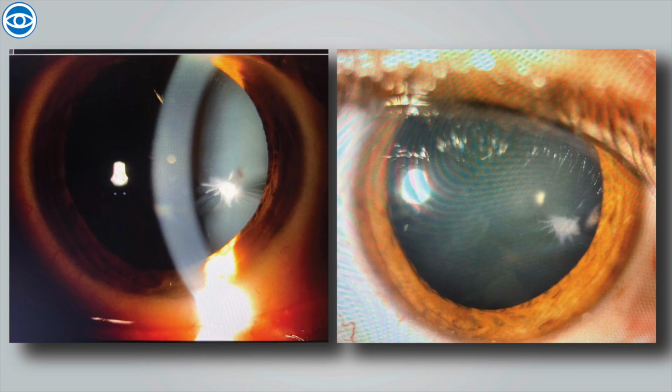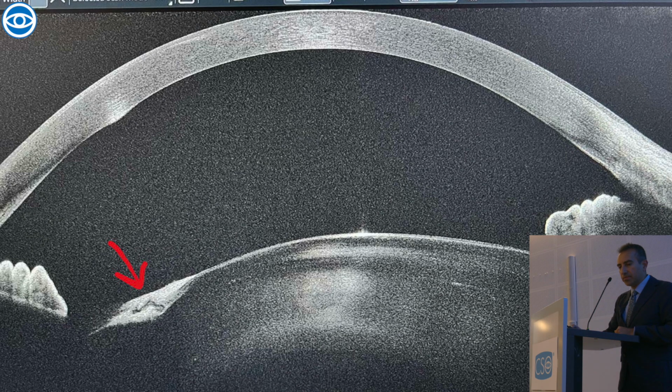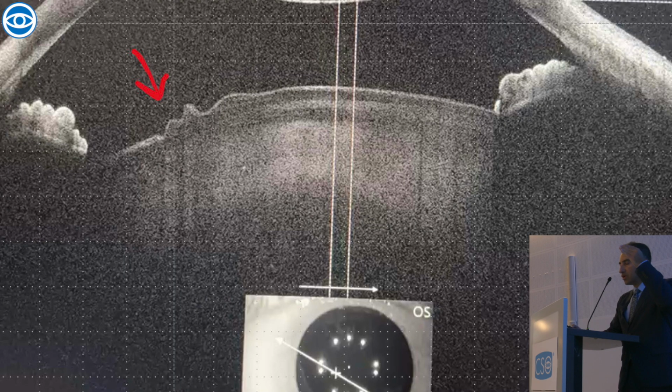Now, typically, this is off-center, okay? So why would the patient be unhappy? Because if you look at retroillumination, that's what you see, a wrinkling of the capsule, producing a lot of trefoil, tetrafoil, and all that. And that's what we were seeing up there. Some coma, a lot of trefoil and tetrafoil, and astigmatism. And that's what OCT would show, the MS39. And again, these are the wrinkling. When I did the video, you could see the wrinkling going all the way in, even though centrally he's fine, but the wrinkling is going all the way in and producing these aberrations.